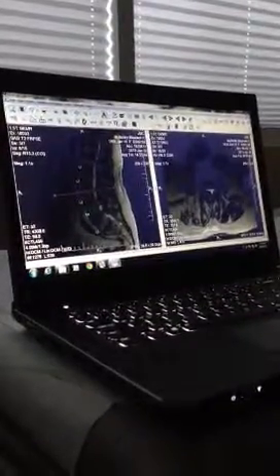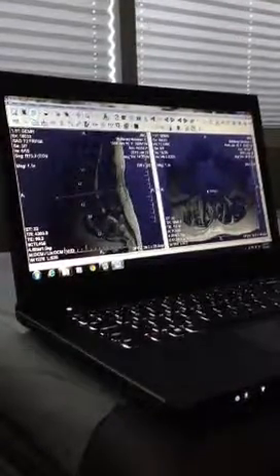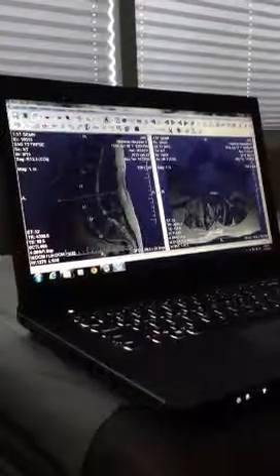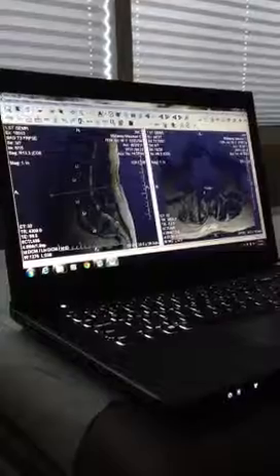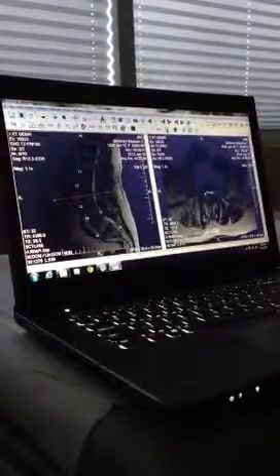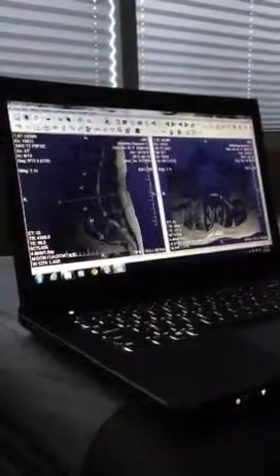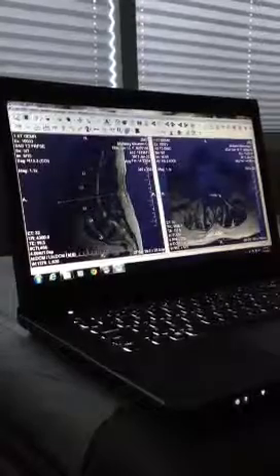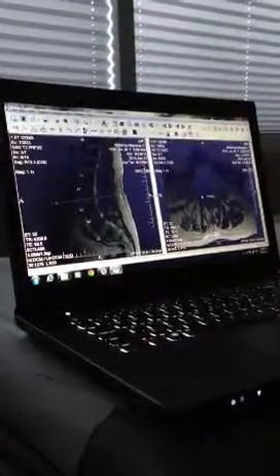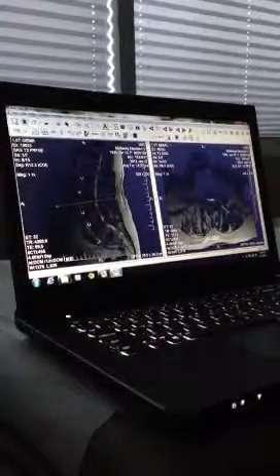Well, the space is left because we have a disc herniation over here. We've lost that nice kidney bean shape. We've got overgrowth of the joint, the facet joint, arthritis, and the other thing is look how big this black structure is, that ligament. Now, on the left side over here, there's a little room for the nerve, but not much. I would call that moderate foraminal narrowing. On the right side, it's very significant. That's L2-3.